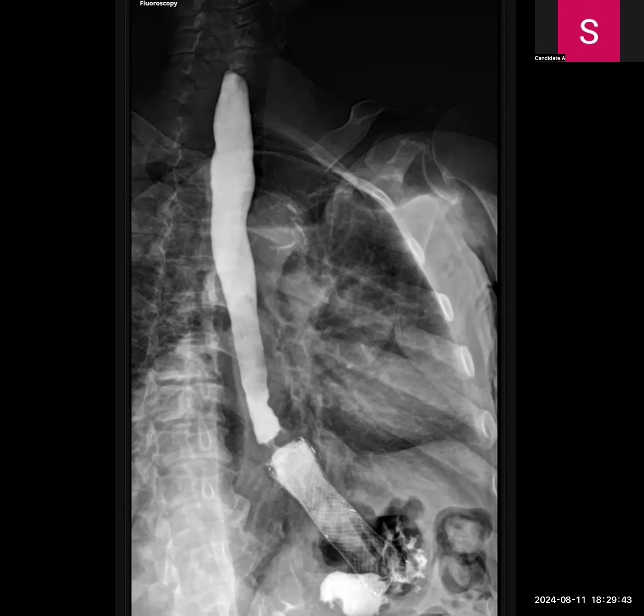So, just proximal to the stent, there is an area of luminal narrowing. So it could be an area of recurrence or spread above the stent. Okay. Anything else comes to mind? Any other possibility?